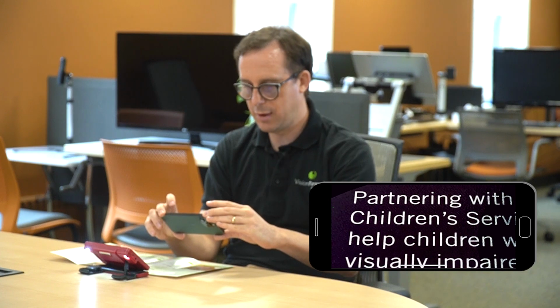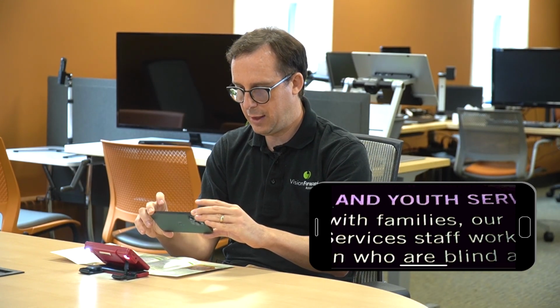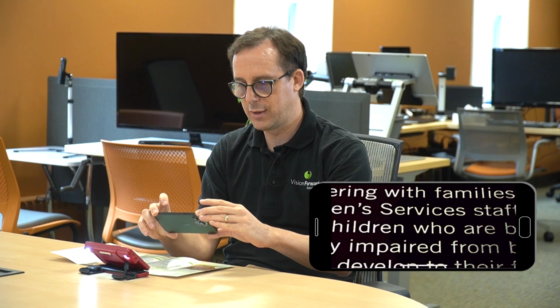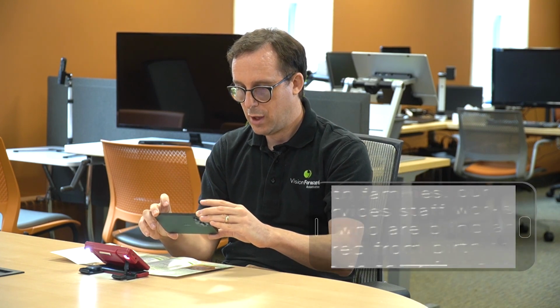So here we are, we're reading a flyer, and I'm just scanning across a sentence here, and I am able to keep my hands pretty steady, but it is still bouncing around quite a lot. And my arms are getting a little tired just trying to hold the phone steady as I read here. So it's not always the best solution trying to read with your phone. Now, the nice thing about the phone is you always have it with you, and it's very portable. So there are definitely some benefits to using your phone.